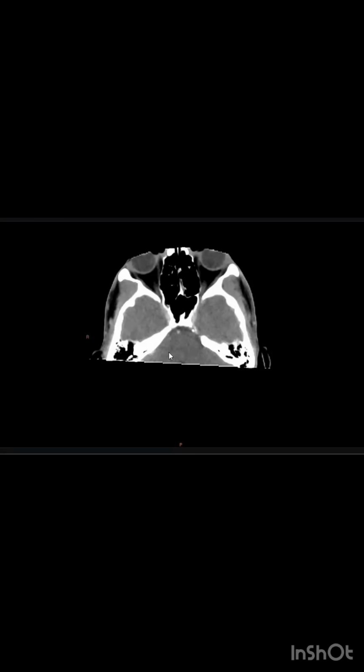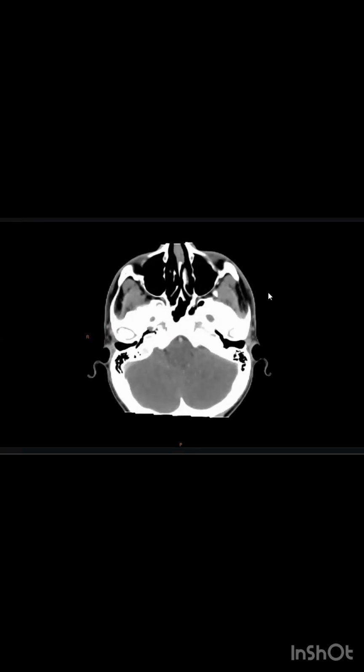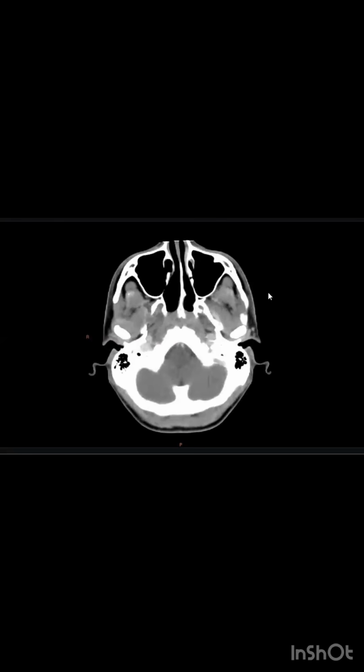Your patient is a 20-year-old male with 10 days of sore throat, neck swelling, and difficulty turning his head or neck. I am presented with CT orbits axial section contrast enhanced images of a patient who presented after a 10 days history of sore throat, difficulty turning his head, and symptoms of fever.